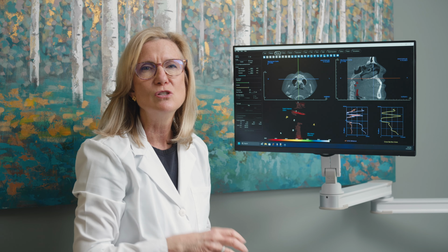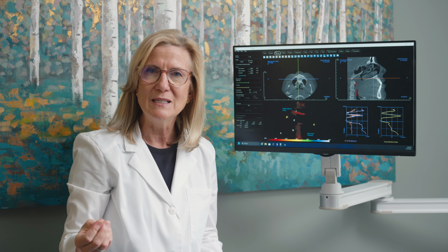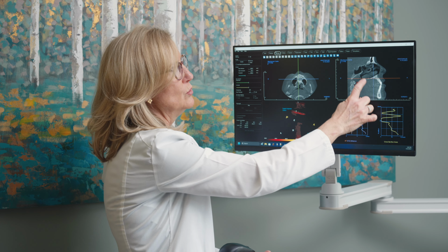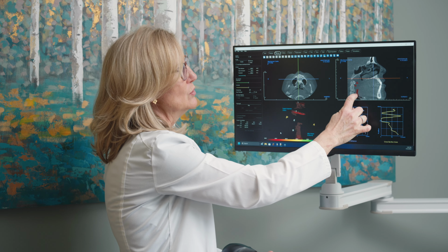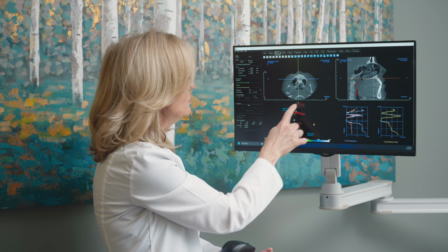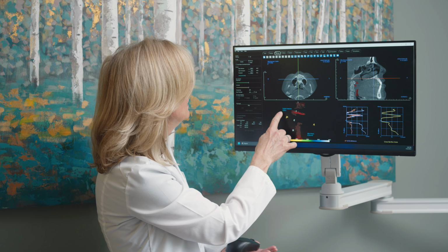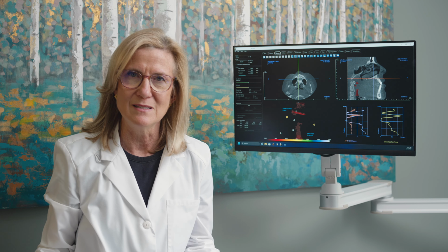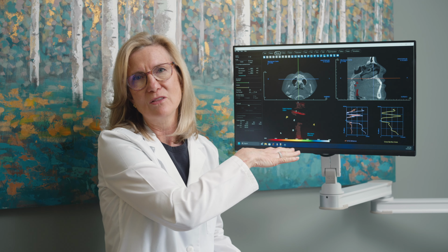Exactly. She's using a CPAP at night, but it's not helping at all because she has swollen adenoids and swollen tonsils blocking off her airway. So you can see the calculation, total volume 3 cc's. Compared to 19 cc's.